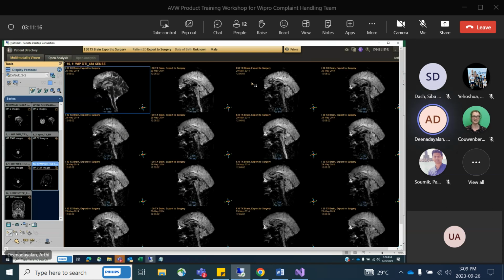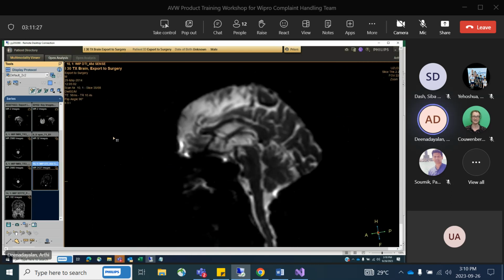It gets displayed in the same way as when I drag-dropped the fMRI, but there is a difference between the two. I'll tell you what it is. Click on the first series. This scan is not a dynamic scan, but instead we call it a B value scan. For a series to be loaded into the diffusion application, you need at least two B values.